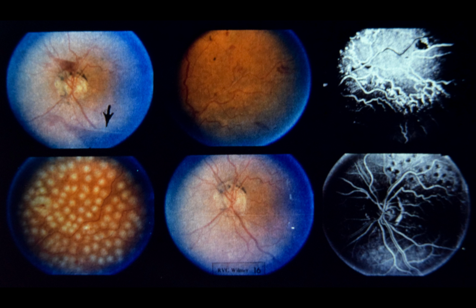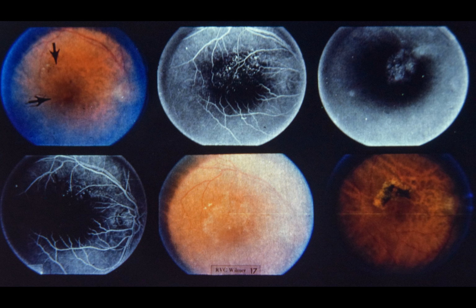Slide 17. Management of branch retinal vein occlusion with macular edema. This 59-year-old hypertensive white male complained of blurred vision in the right eye for 1 year. Best corrected visual acuity was 20/70. Incipient cataracts seen on slit lamp examination precluded crystal clear fundus photographs. Upper left, note macular edema and lipid deposition superior to fovea.